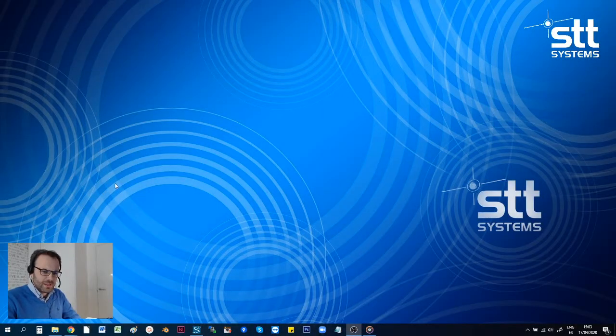So I'll be sharing the desktop and showing you some of the new features straight away. Please don't hesitate to ask any questions while I speak. There's someone else helping me out with the answers.